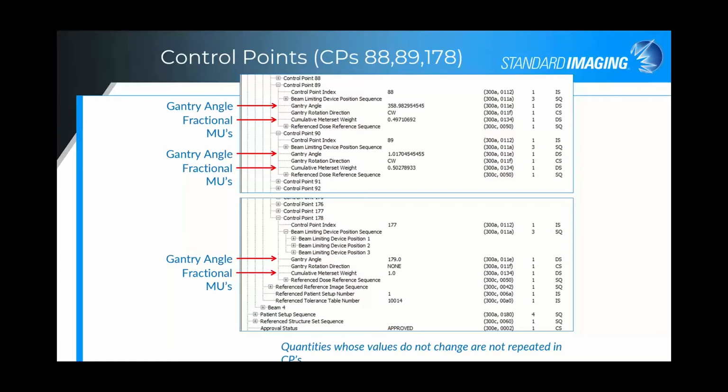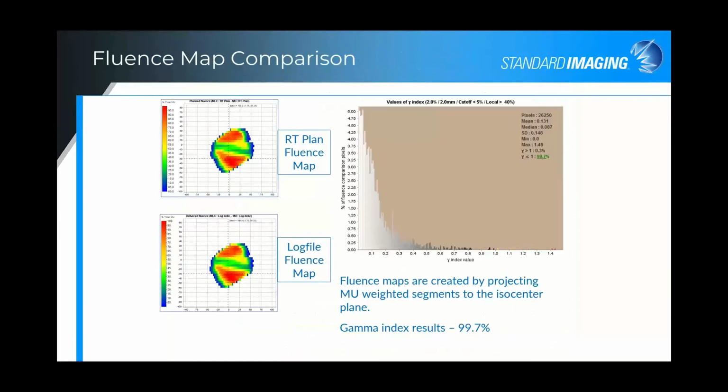And this linking allows us to do the analysis in LinacView and make some comparisons that are clinically relevant, because we generate a Fluence map based on the RTPlan, and then we go ahead and generate a Fluence map based on each daily delivery, as well as a composite for the entire treatment for the patient.